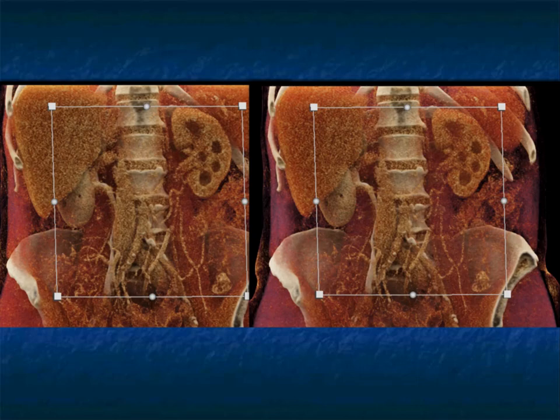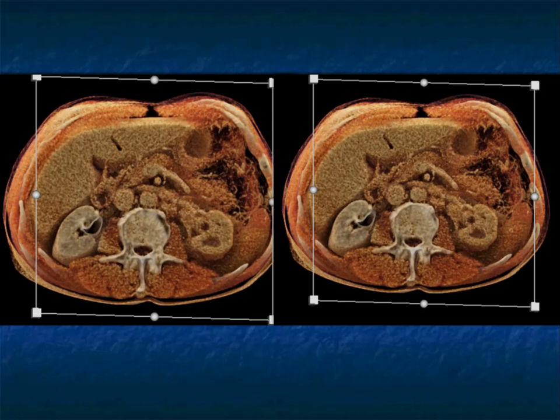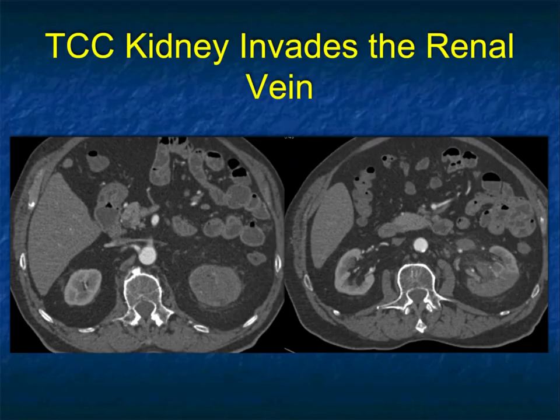And again, very nice correlation with the regular 3D or the coronal views. And cinematic rendering is very valuable when you're looking at the renal pelvis. That indeed could be very, very helpful. So it's something you need to think about, and it's something that's really good to do. So I think you will find that to be very, very helpful. And here's just one more set of images.